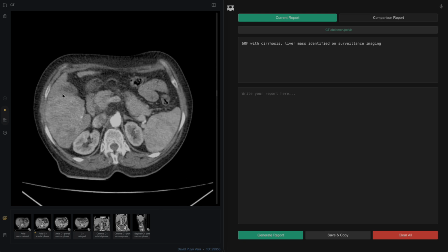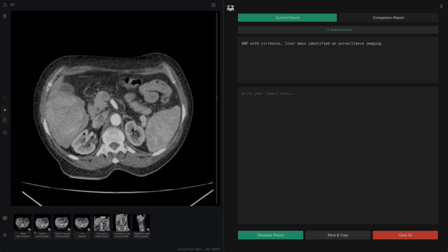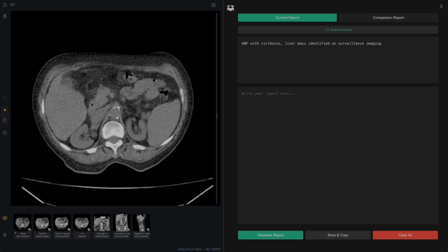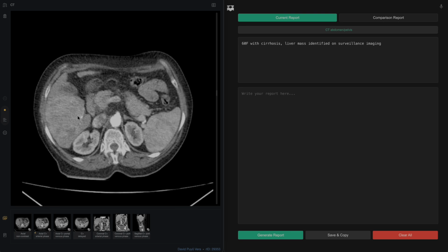and we can immediately see when we look at the right lobe of the liver that there is this large heterogeneous high attenuation mass centered really on segments 5 and segment 6. This is really high attenuation. We suspect that's because it's enhancing in the arterial phase, but we can look across to our non-contrast images and see that, yes, indeed, it wasn't natively of high attenuation. So that's arterial phase enhancement.